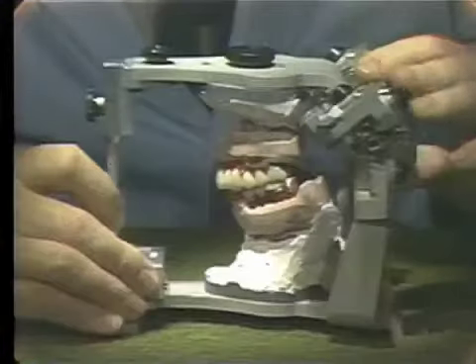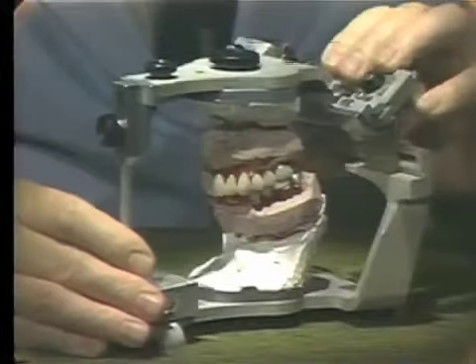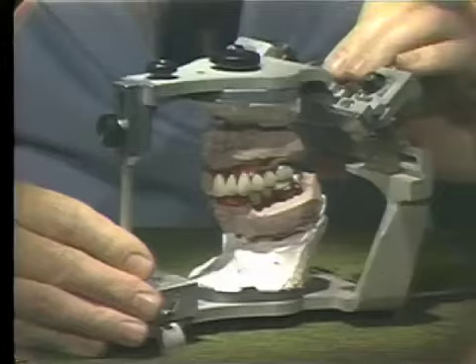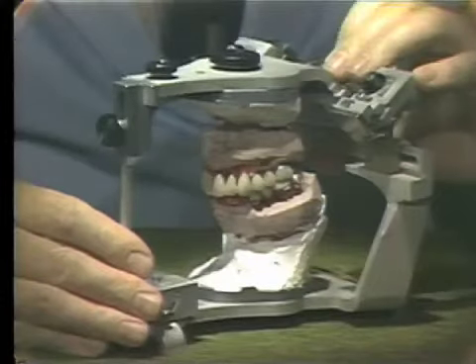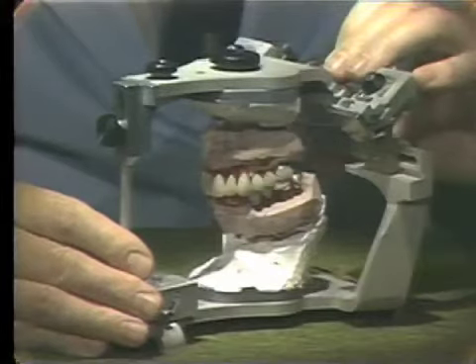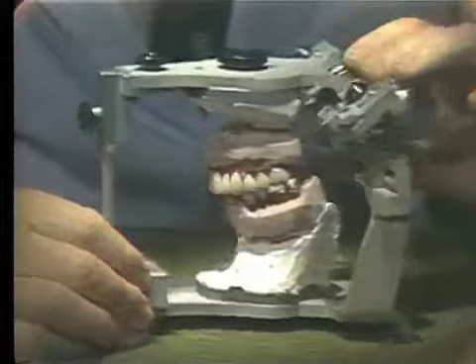So we'd now go to the mouth, try in all of the castings, verify the accuracy of the margin, go ahead and modify the porcelain, and send it back to the laboratory for soldering of the bridges and glazing of the porcelain. Then when we get it back, we will do our remount procedures.